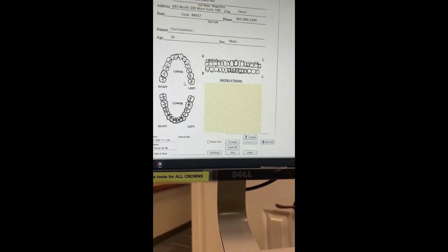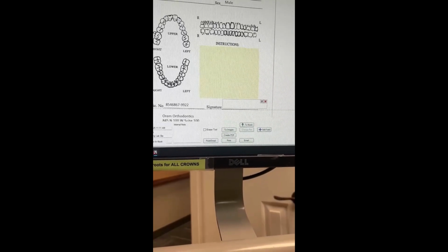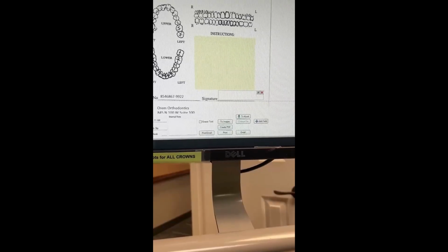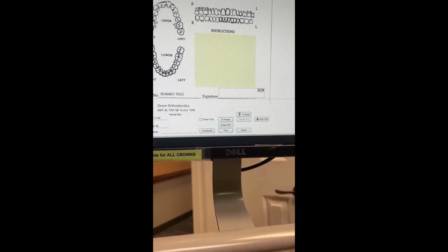And then we just have the instructions for what we're doing. So we're gonna go here and then draw the instructions for what we're doing for this guy.